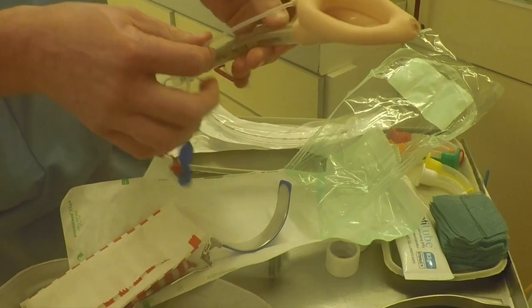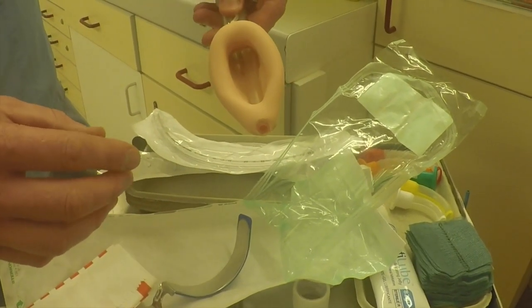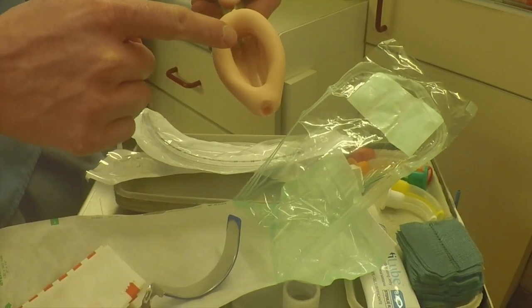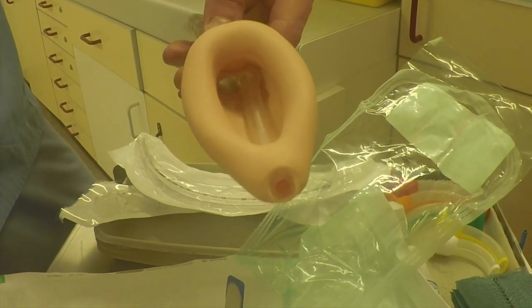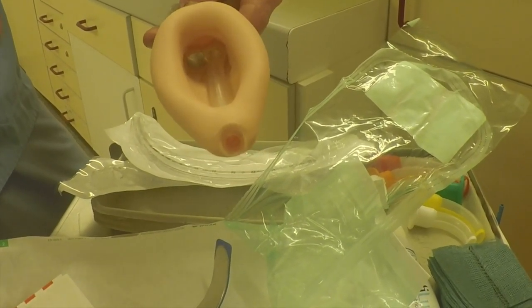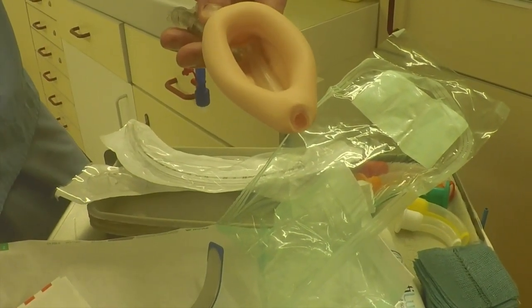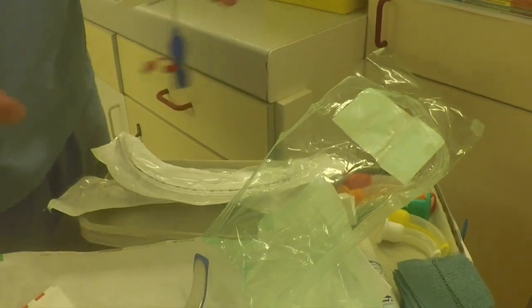The next piece of equipment is known as a laryngeal mask airway, or an LMA. These sit above the trachea with the mask covering the larynx in a sealed system. This model is an example of those that have a tube sitting over the esophagus and enable the gastric contents to be expelled and removed safely in cases of reflux, thus reducing the risk of aspiration.